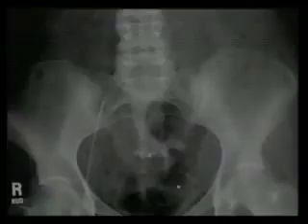These are vascular calcifications. There's a right femoral venous line. The femoral arterial line will always be a thin little line, and it's going to be out here. I guess it goes vein, artery, nerve. In interventional, you need to know that because if you have to stick the artery or the nerve, you need to know. But what is this thing?